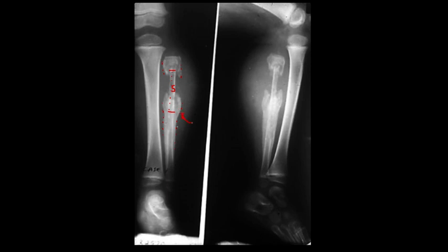So that's not a great arrow. So all involucrum in these areas. Again, we can see it in the lateral view as well. It's that solid periosteal reaction trying to surround and separate that sequestrum or the sequestered necrotic portion away from the healthy tissues. And then we have this opening here where the area of the dead bone can go out into the immediately adjacent tissues. This would be a cloaca.